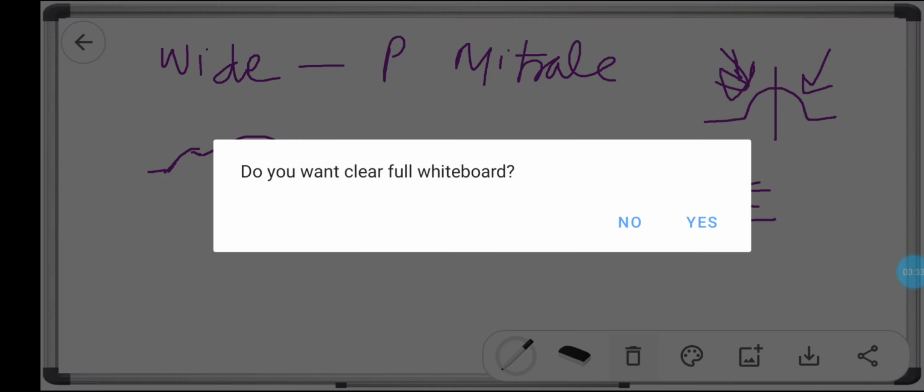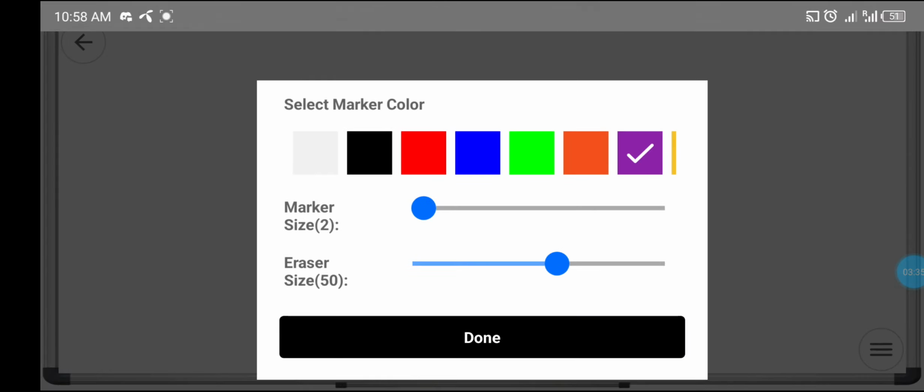The second thing we can discuss over here is, let me change the pointer. This is in left atrial enlargement, that is a P mitral. You can remember it like this: your mitral valve is on the left side, and if there's a left atrial enlargement, there can be mitral stenosis. So there would be left atrial enlargement leading to the P mitral.